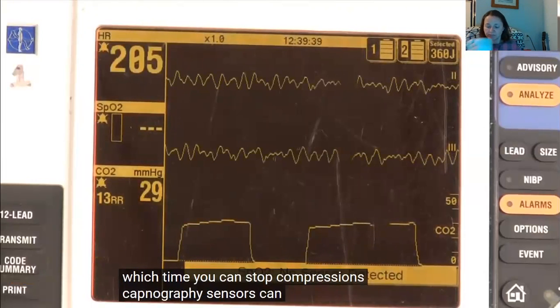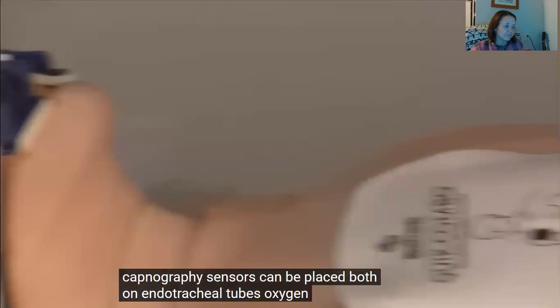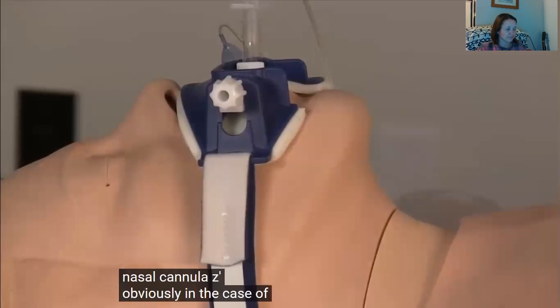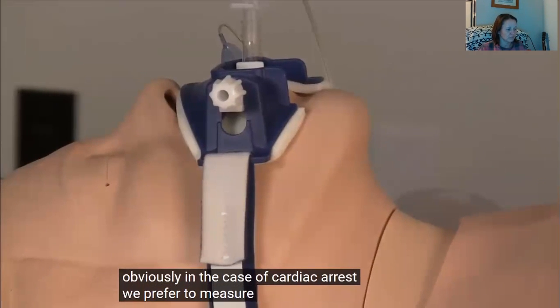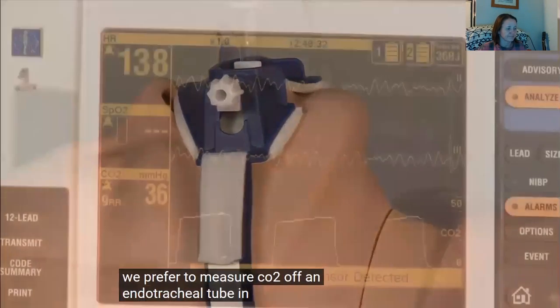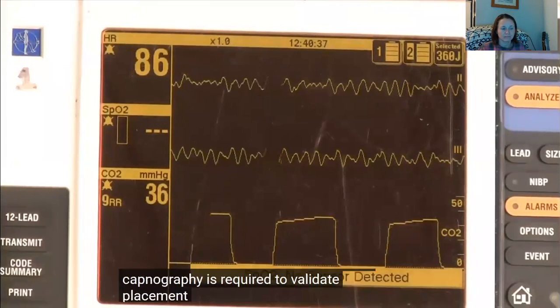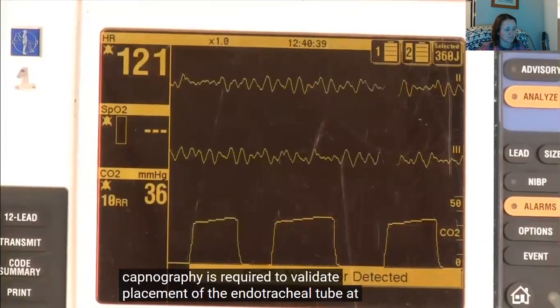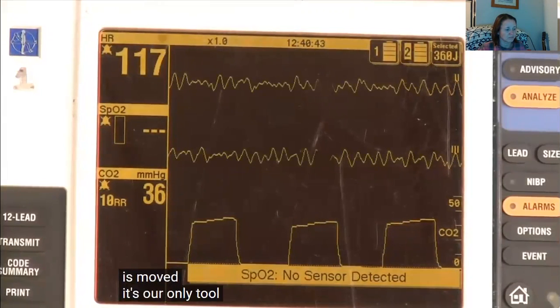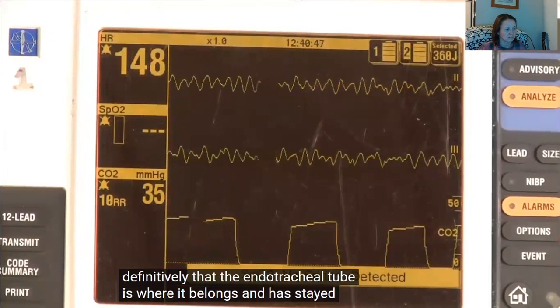Capnography sensors can be placed both on endotracheal tubes, oxygen masks, or nasal cannulas. Obviously, in the case of cardiac arrest, we prefer to measure CO2 off an endotracheal tube. In addition, waveform capnography is required to validate placement of the endotracheal tube at intubation or any time when the patient is moved. It's our only tool that tells us definitively that the endotracheal tube is where it belongs and has stayed there.